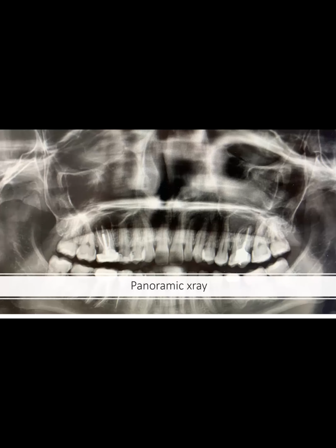And since this area is very close to the maxillary sinus, do you want to have better imaging? I do. Right. So what's the next step that you want to do? 3D imaging, CBCT. Wonderful. So Dr. Sally can show us the 3D imaging.